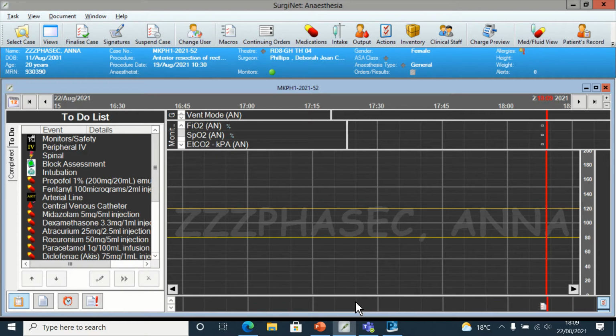So when a patient comes into the anesthetic room, you start the macro. That's the time for you to put in the cannula, attach the monitors, and then go for washing your hands if you plan to give a spinal. The macro will start recording the numbers once the macro is started, so the numbers will all be there. And then you come back and do the spinal, and then you do the GA.